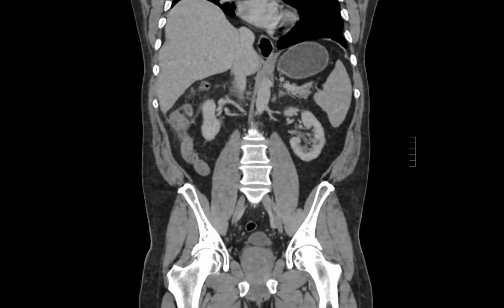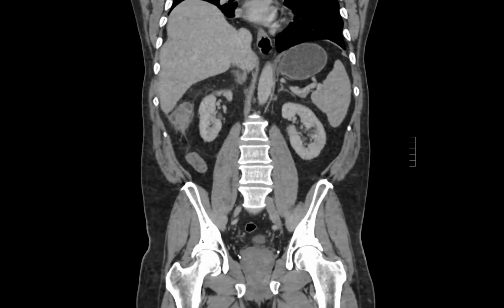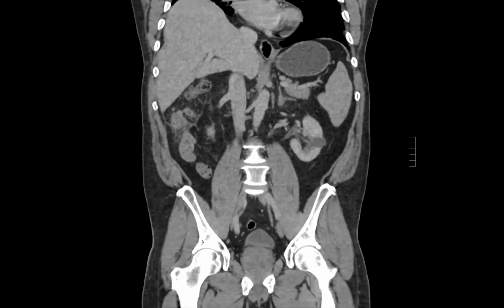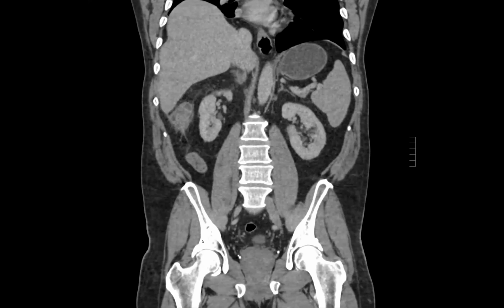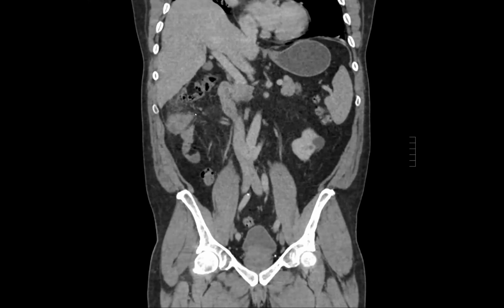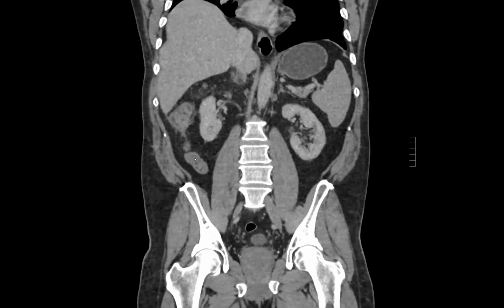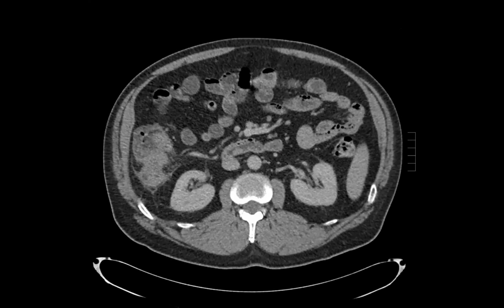Can you scroll through again? Yes. Okay, so in retrospect, would you have called it? It doesn't look as distended as a mucocele usually looks, although I agree that the wall looks kind of thick. Thick and irregular, and maybe there's a couple of nodes there. It doesn't have the same inflammatory process. I think it would be a very amazing call if someone called that prospectively.